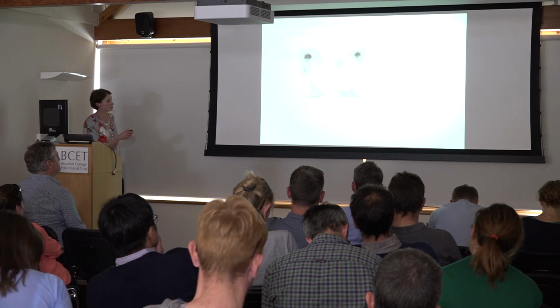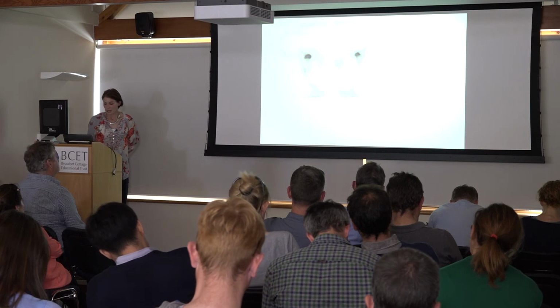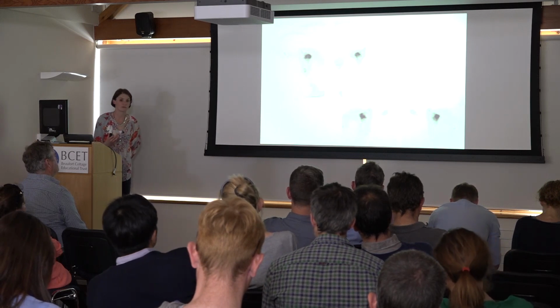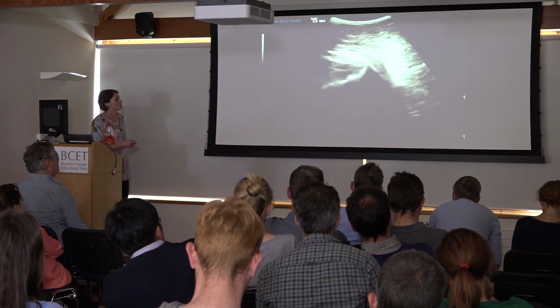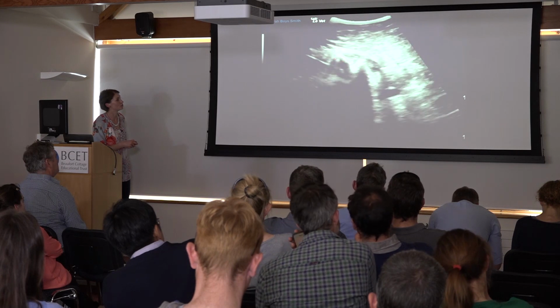There can be quite a variable amount of bone scan uptake with these, so we can obviously see a significant uptake here by this third trochanter on the left, compared to, say, this one where we've got a much more subtle uptake. But again, this can help you potentially determine the chronicity of the fracture. So a little bit like your ilial wing stress fractures, it can help you determine the significance of this compared to your ultrasonographical findings. So here we've got superficial gluteal, and we've got obvious disruption of this third trochanter, obvious fragmentation.